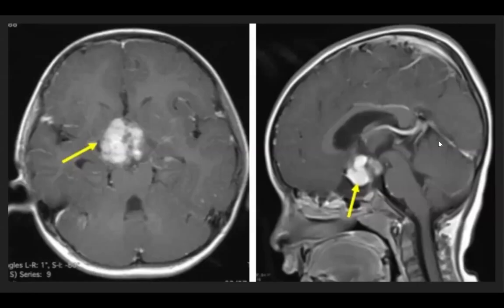This one is even more interesting. What would you think of when you look at this radiological presentation? Craniopharyngioma. Exactly. This looks like a stereotypical presentation of craniopharyngioma. The lesion is suprasellar, and you see slightly solid cystic heterogeneous, and there is contrast enhancement, but that is heterogeneous as well. So the location and the radiological presentation is very typical for craniopharyngioma, and I think it would be a surprise for anyone who sees the post-op biopsy that shows pilocytic astrocytomas.